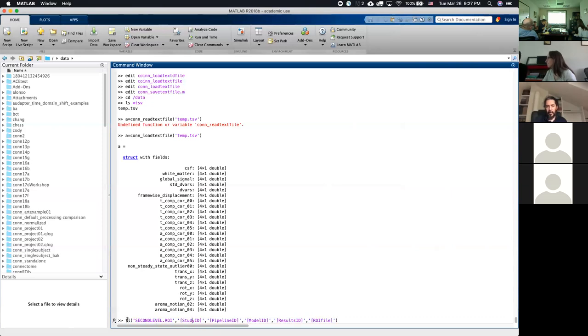So this is basically the same syntax. When you call the FL function, you just pass parameters to it. When the parameters are strings, they can be passed as different elements within the parentheses, separated by commas. So when you have multiple files, you can enter here what is called a cell array with multiple files, something like data file1.mat and data file2.mat.